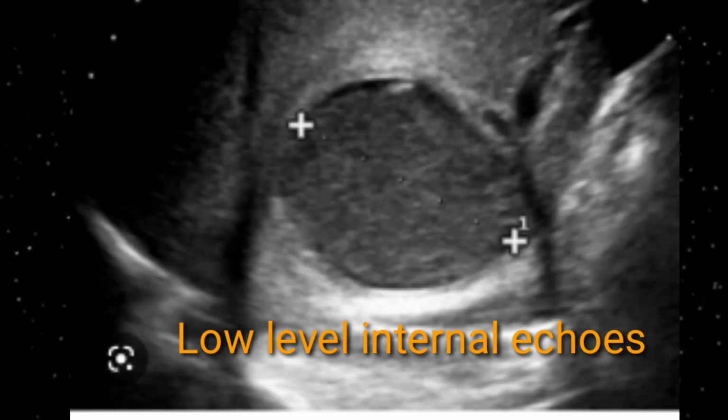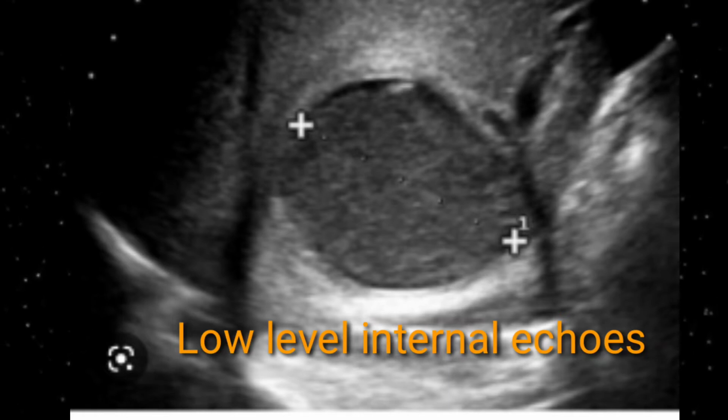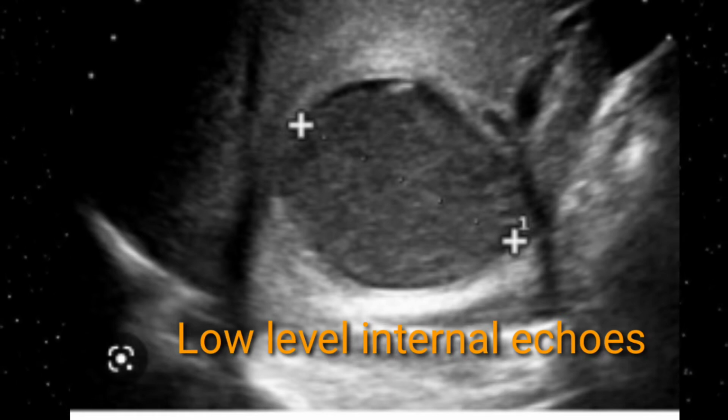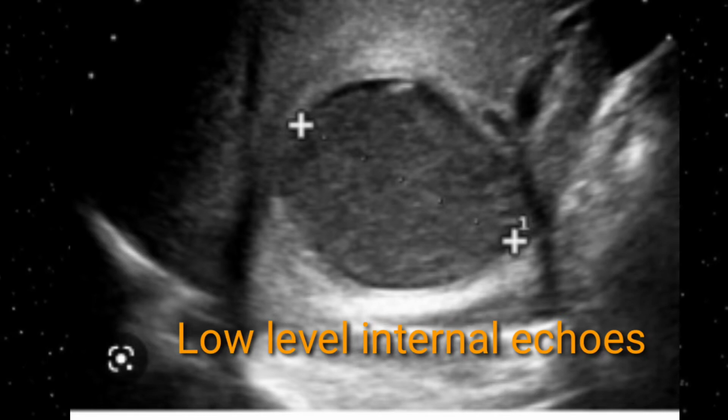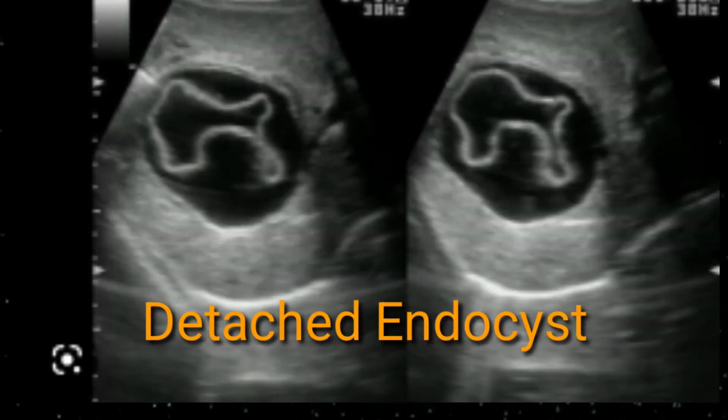Hydatid cyst is caused by Echinococcus granulosus, and it shows multiple sonographic features, especially on liver imaging. It appears as a simple round cyst with low level internal echoes, and you can appreciate on this slide this round cyst with low level internal echoes. This is the classical example of the liver cyst. On these images you can see a well defined cyst with small detached endocystic layers, and this is another example of the hydatid cyst. It's called the water lily sign.